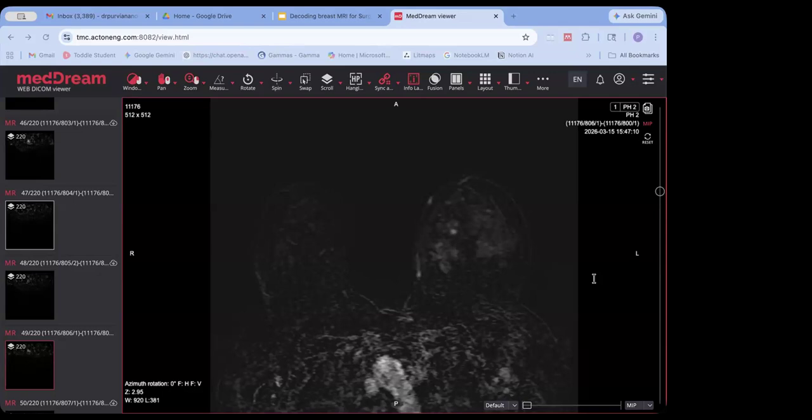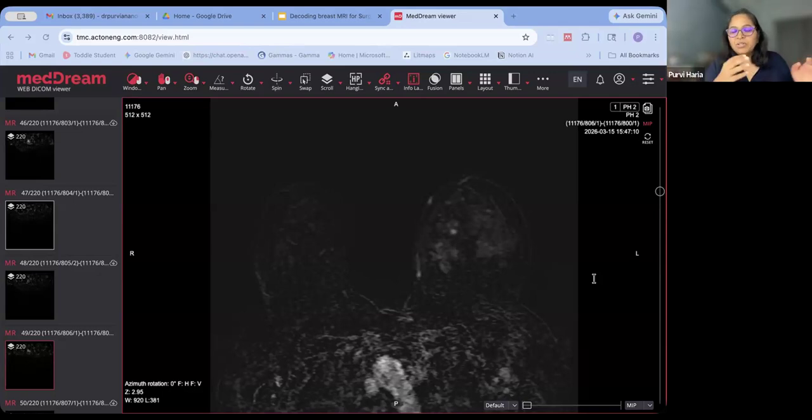Right. So it will subtract out in the subtracted sequence. If something was hyperintense on your first phase, it will subtract out from the second phase, so whatever we see is only enhancement. Many times we have seen one very nice duct on the T1 sequence, but on the subtracted images there is no enhancement. It is just inspissated secretion inside the duct, for which we would otherwise probably do some surgery or microdochectomy. So you need subtracted images.